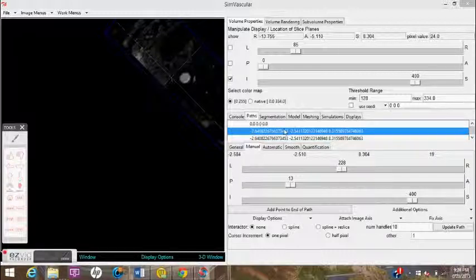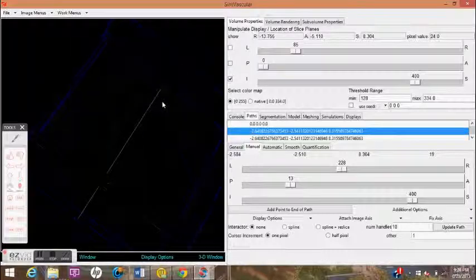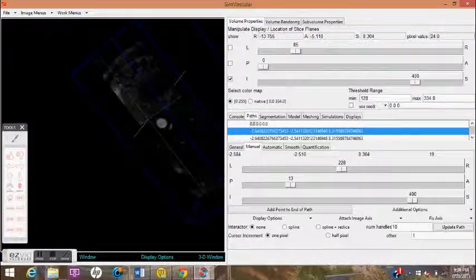And as were these points here, I accidentally held down the T. You want to make sure that you just hit the T, you don't hold it down, because then you're going to get a ton of points like I did there. But it works out because we're going to show you how to delete those points.